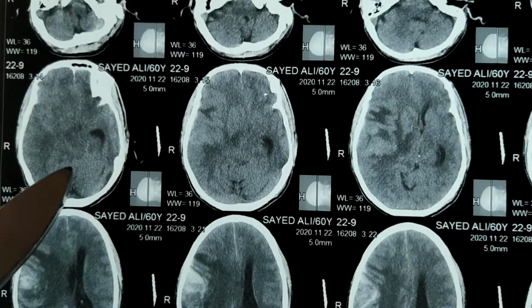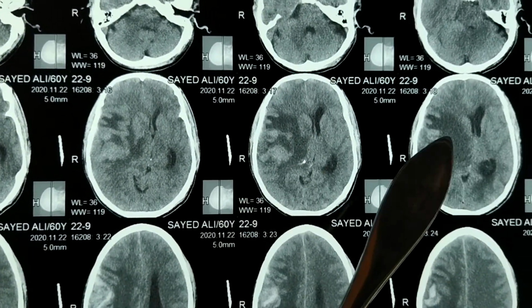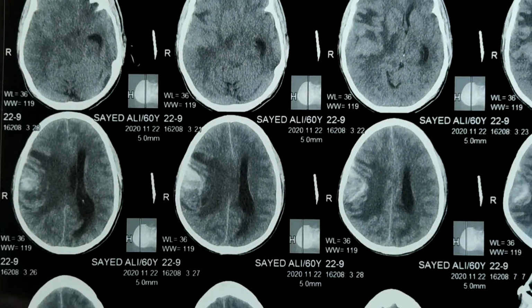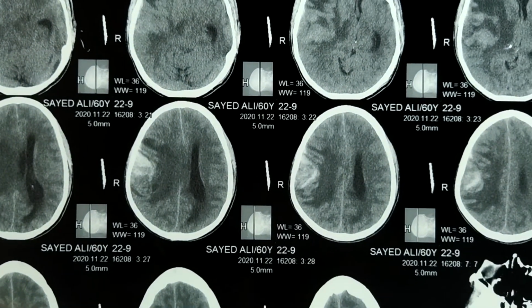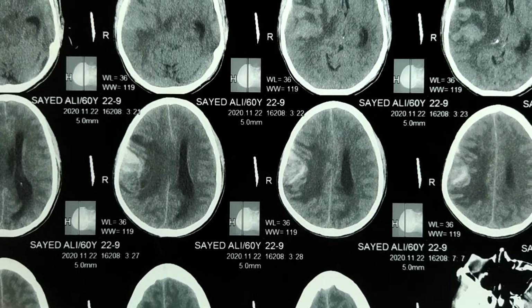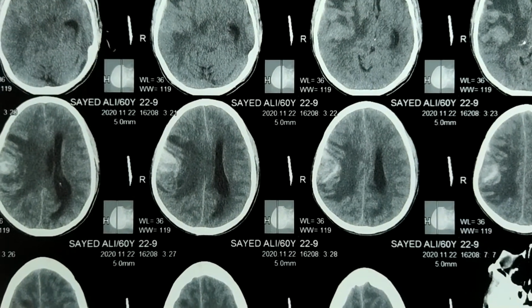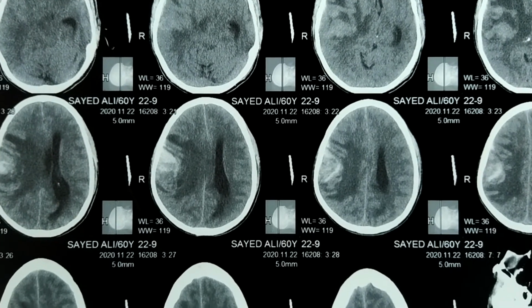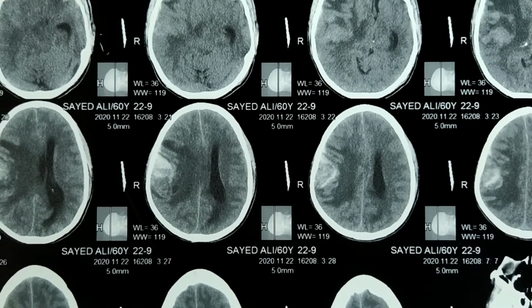The upper segment, look at here, the upper segment shows actually the lesion, perilesional edema. At first look you may be confused that this might be a case of hemorrhagic stroke with perilesional edema. Of course, the hemorrhagic stroke is the first DD, but the provisional diagnosis on this CT scan should be a space occupying lesion in the brain.